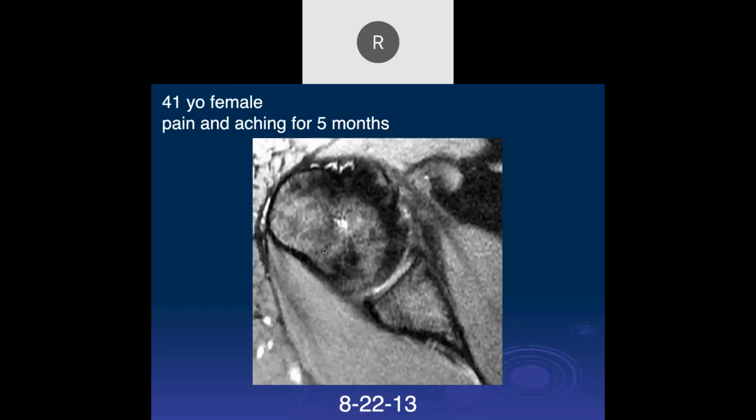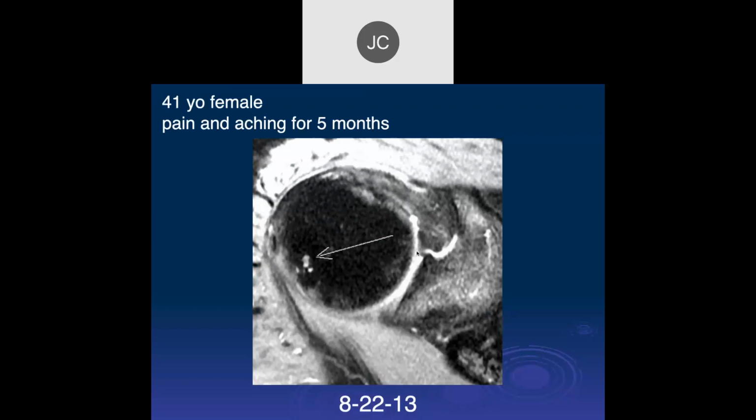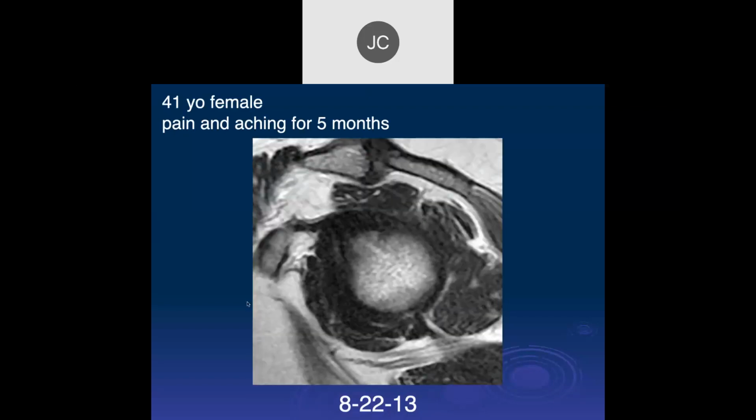Okay. So this was called an anterior labral tear. Right here, I see. And then there's a concern of possible Hill-Sachs back here. As you can see, that's not a classic Hill-Sachs lesion, where sometimes you can just get abrasions, which this could be a Hill-Sachs abrasion. Okay, so this was called an anterior labral tear.